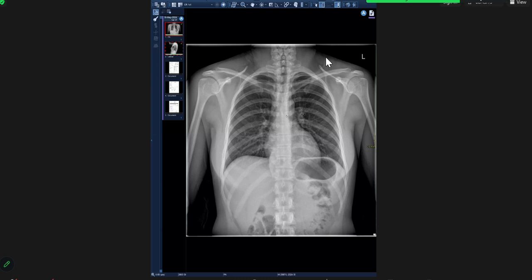So whenever you're looking at a sickle cell patient, you try to see the gallstones, you try to see the H-shaped vertebrae, you try to see the avascular necrosis of the humeral head, and always try to see whether you can make out the splenic shadow or not. Because when the splenic shadow is not there, then it has this. Now here the spleen is there, so that's why you see the colon here. But you might see some calcification here, which will lead you to say that this is that. So that's it.